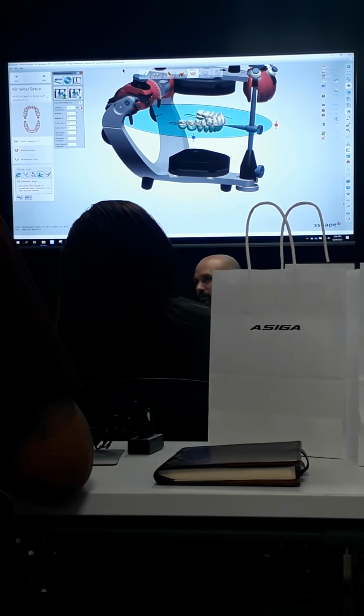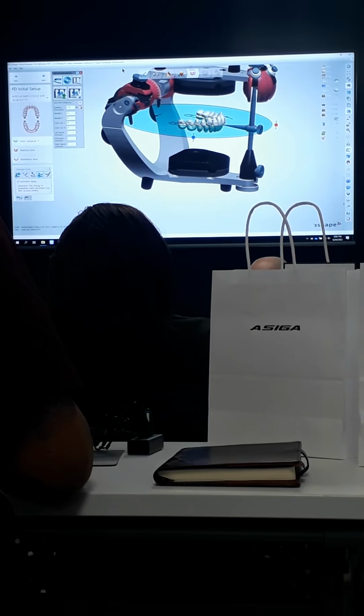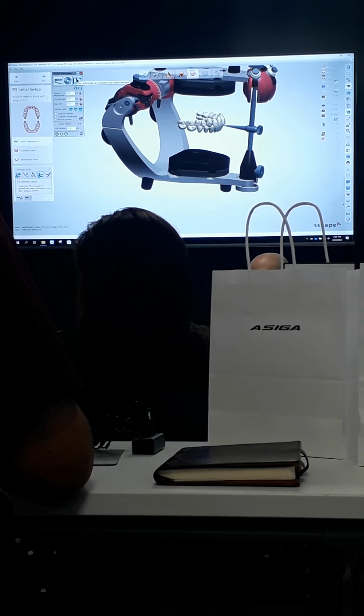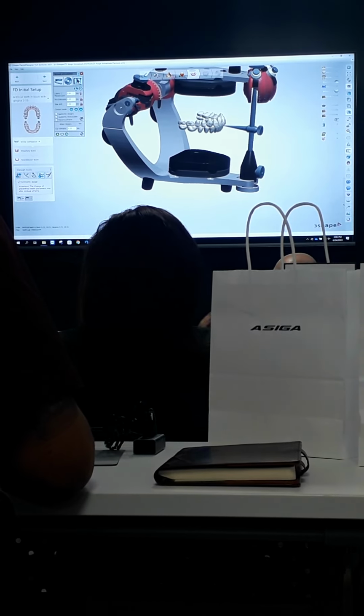If you have the wrong values on the physical articulator, then it's going to transfer the wrong values here. Click here first. And then this is your functional icon, is what I call it. This is where you actually run through the movements on the virtual articulator. Right click on that and it shows you those blue markings.